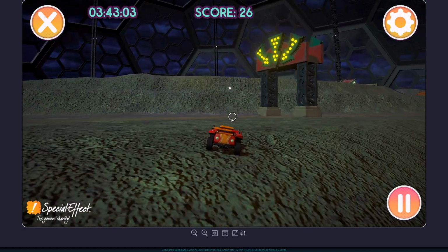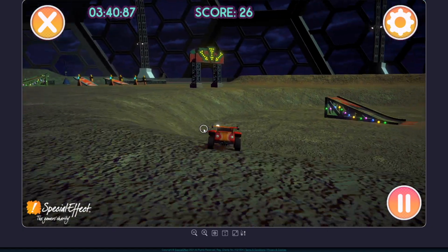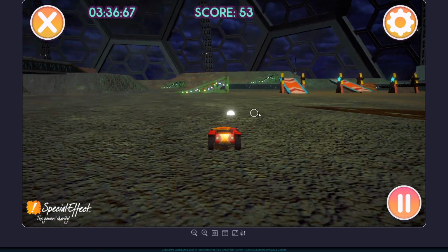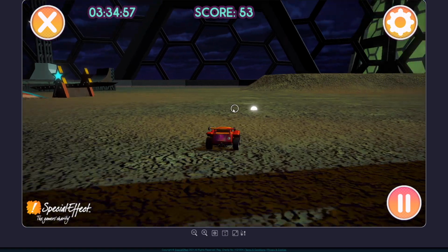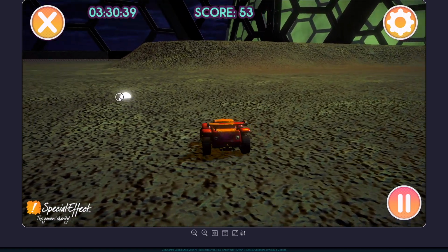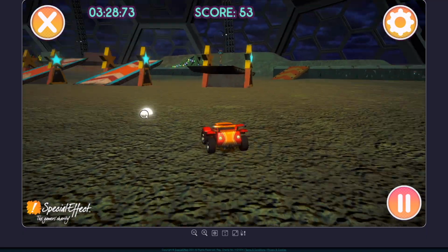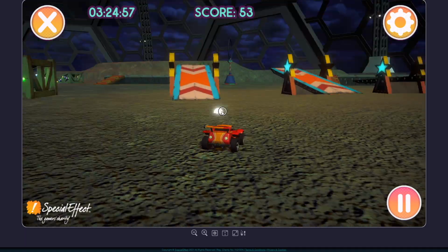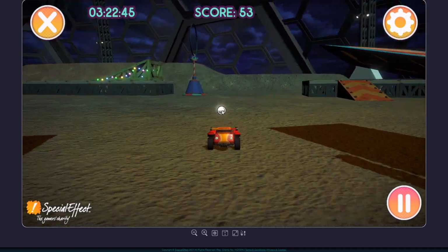Precise gives you direct and constant control of your vehicle. So you look left and right on screen and the vehicle follows your gaze. You look up to accelerate and down to brake and reverse. The orb on screen shows where you are looking and represents the mouse cursor. Therefore, to use this method, you need to be able to have constant control of the mouse cursor position using your iGaze camera.